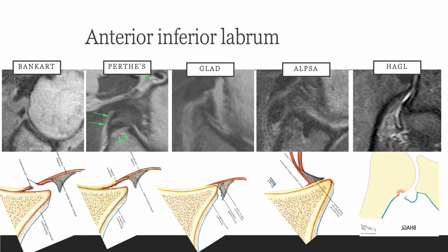The third lesion is that when you have an anterior dislocation, you can have not only the labrum, but along with the labrum, a small portion of the glenoid articular cartilage also coming off, and that is referred to as a glenolabral articular defect. And so here in this case, you can see this is the anterior margin of the glenoid. This is the actual labral tear coming off. This is a small piece of bone in the Bankart, and here you can see this articular cartilage, which is this gray layer back here, and you can see how it's thinned out and there are little flakes or streaks of articular cartilage here, and this is called a GLAD lesion or a glenolabral articular disruption.